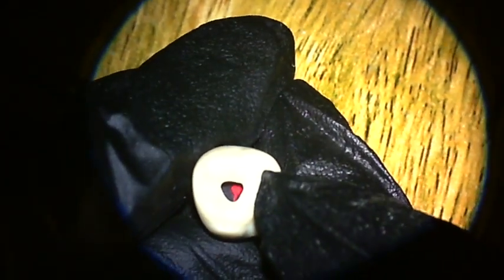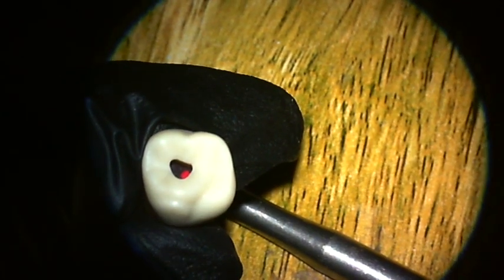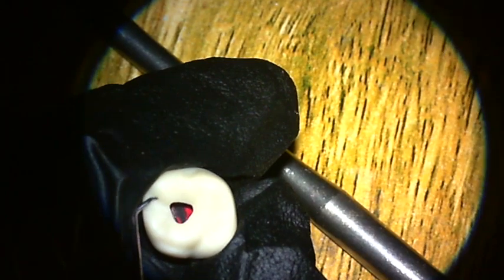Of course, you can get 3 in this criterion where you have selected the right tooth, so you get full marks, 3. Damage to adjacent or assessment tooth beyond preparation. Most likely this happens if you injure the outer surface, the outline. Any part shouldn't be touched by any minor scratch. That is considered as a damage.